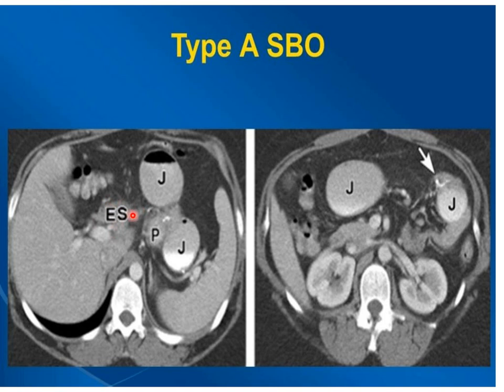It's empty. And the jejunum on both sides with the small pouch is filled. This one is also called small bowel obstruction because of the signs and symptoms.